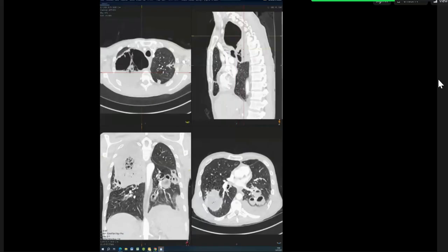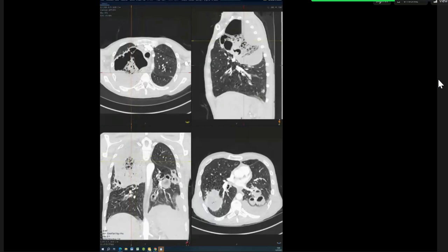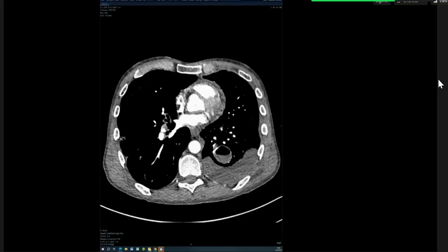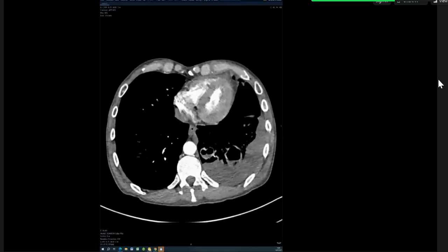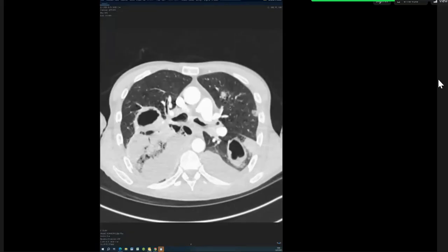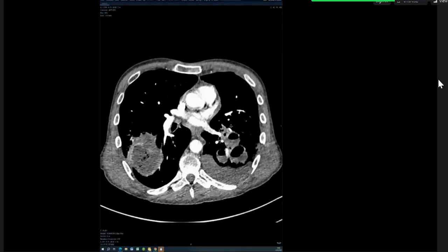Okay. And this thing floating inside it, what is that? This may be a pus component, or maybe a piece of necrosis in the parenchyma. Okay. So you have multiple lung abscesses, bilateral, air fluid level, and thin walled. You didn't mention the wall. And you said there was a pleural effusion, and rightfully so. You said it doesn't look like an empyema. So you also consider TB. All of the lesions are thin and irregular.